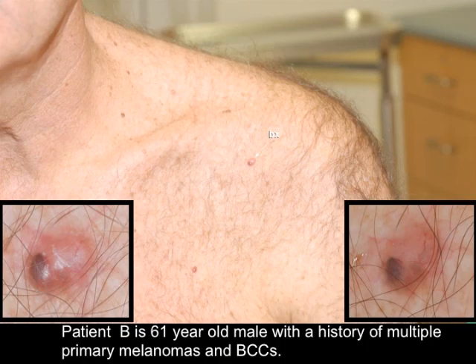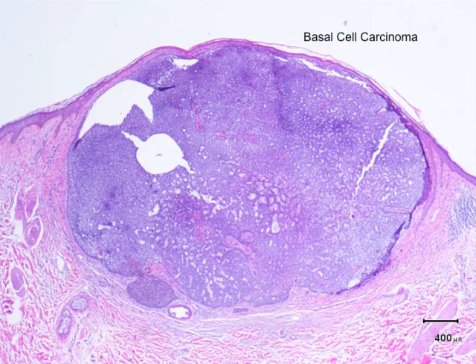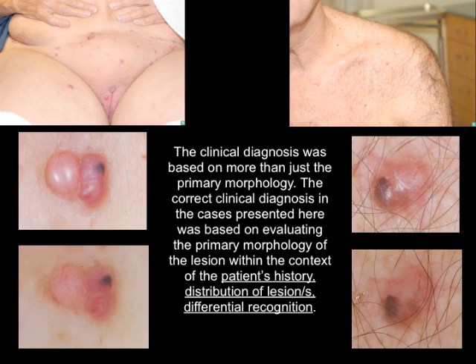Patient B is a 61-year-old male with a history of multiple primary melanomas and basal cell carcinomas. This lesion was a basal cell carcinoma. The pre-biopsy diagnosis is based on more than just the dermoscopic primary morphology of the lesion in question. Based on patient history, differential recognition process, and dermoscopic morphology, an accurate diagnosis can be rendered before a biopsy is performed. Let us now examine case 3 and 4.